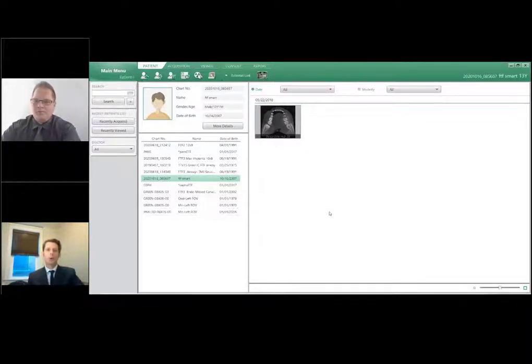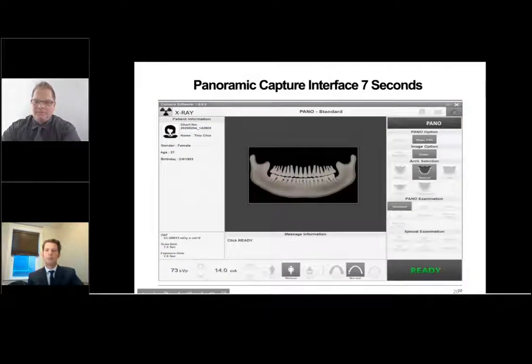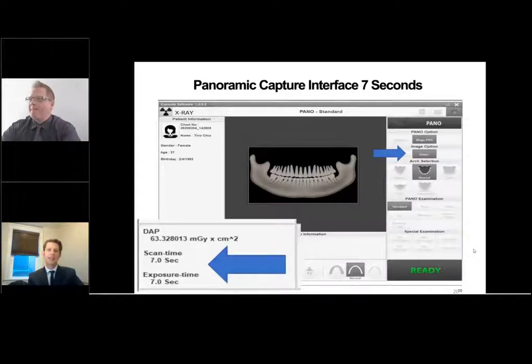Paul, should we go into more of our images now, and let's look at actual patient positioning. One of the things we highlighted was the 2nd scan here with the green. If we do have any patients that have dose radiation concerns, like you mentioned, patient movement or anything like that, that's where I would use that 7 seconds there. Yeah, that's really helpful.